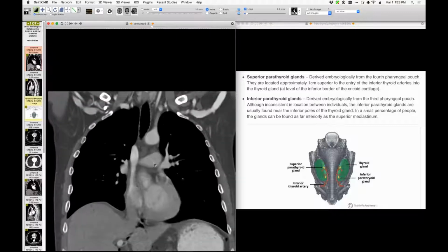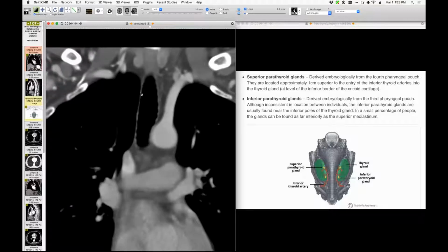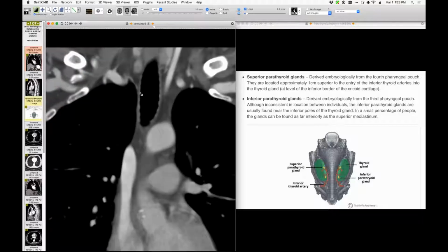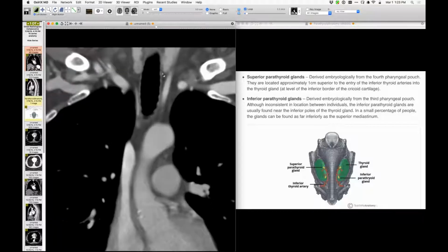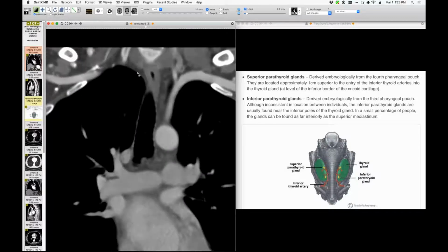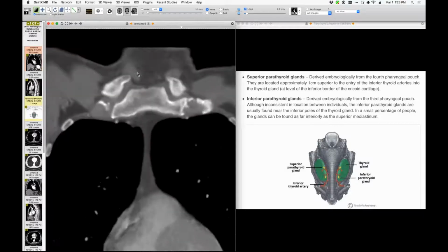You think it's just that they're big and that's why they become visible? Because they're really plump? Yeah, they're definitely big. I think these are ordinarily just like 5-6 millimeter structures? Small guys. And this one over here particularly is quite big. This is the biggest of the 4 that we see here. So that's really just curious. But we see all 4 parathyroids being big. It's just hyperplasia. Yeah, hyperparathyroidism, hyperplasia, presumably.